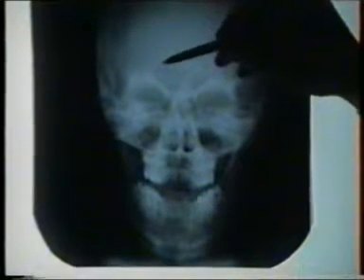Normally the frontal sinuses are paired sinuses, however the anatomical size has no relation to the pathology. The size of the sinuses may be different, and they are never paired as far as size is concerned. Normally, as you see over here, the frontal sinuses show intercellular septae. This gives it a clove-like appearance, which is also known as a scalloping appearance. This means that each frontal sinus is composed of a number of air cells which constitute one frontal sinus.